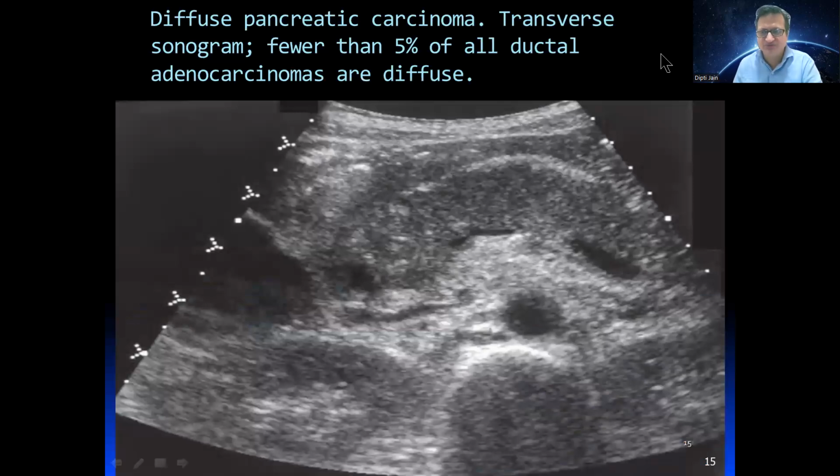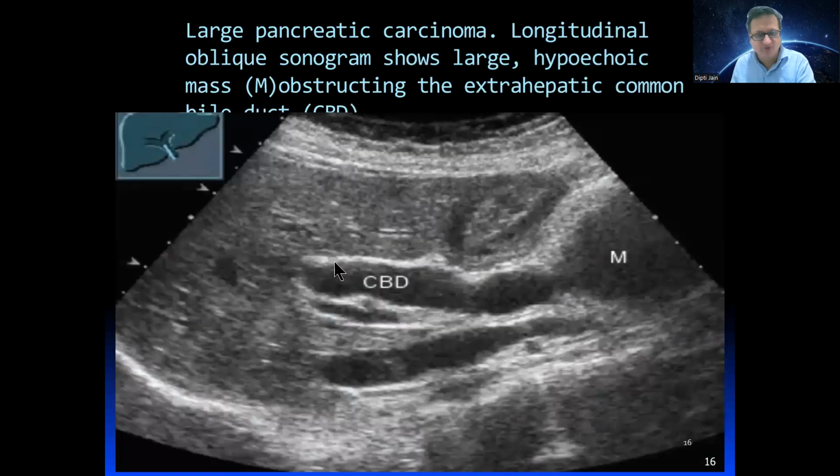These are a few ultrasound pictures showing pancreatic carcinoma. Here there is a diffuse involvement of the pancreas. Only 5% of all ductal adenocarcinomas are diffuse, and this is the rarest of them. So this is the rare tumor, the diffuse involvement.